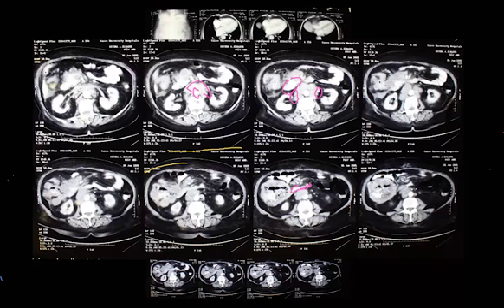What is the differential diagnosis of this lymphadenopathy? These are the lymph nodes anatomically, but pathologically, always anatomy and pathology, what is the pathology? Malignancy. Malignancy meaning spread from a tumor. So you think this may be metastasis from another primary? Yes, maybe. Absolutely. What else could it be? A para-aortic lymphadenopathy.